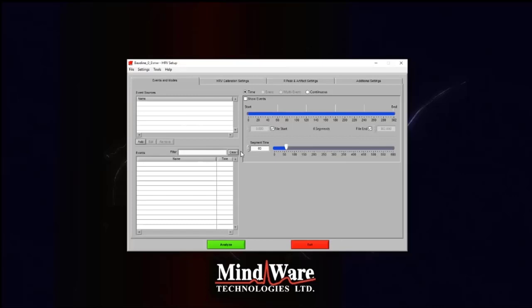Okay, going back to the events and modes real quickly, I just want to highlight that, again, we're not going to have any events in here. We're not sorting by events that occurred during the session. Those events can come from keyboard presses, or specific instances in the study, such as the beginning of baseline and the end of baseline. Those don't have to be their own files. Those could just be event markers that we're placing within one file. So there are multiple ways to break this down and look at the data. But in this case, I'm doing this without events to keep things simple. Again, we will be doing an events and modes webinar in the near future. And if you have any additional questions with that, that'll certainly clear it up.